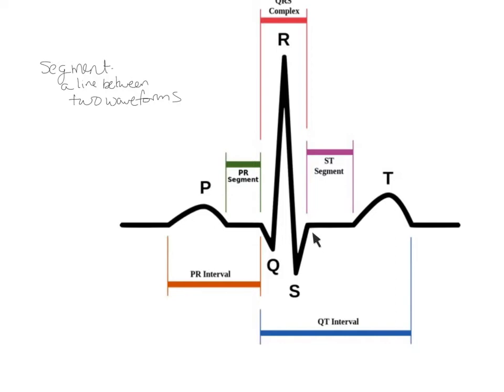And that J point is going to tell me whether there is any ischemia, injury, or infarction on the heart. So what I mean is that this J point, with the presence of ischemia, will start to be what they call depressed, meaning that the J point will actually happen here, and the S wave only rises to about there and starts to form the T wave. On the other side of the scale, you could also have ST segment elevation, where the S wave rises above its average baseline, so it happens up here, and then starts forming the ST segment and the J point over there. Okay, so that's ST segment elevation. I don't want to get too far into it here, but do expect it in a future video. Okay.